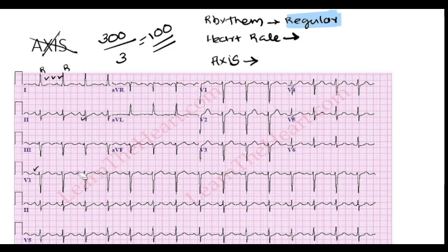Next one is about what? P is over, Q we have finished. Now looking at the QRS complex. First thing is QRS complex is present or not. Every P wave in this ECG is followed by a QRS complex. So there is no missing of QRS complex. So we again excluded a different type of heart block. Again, heart block will be discussed in a different lecture. Okay, so QRS is present.